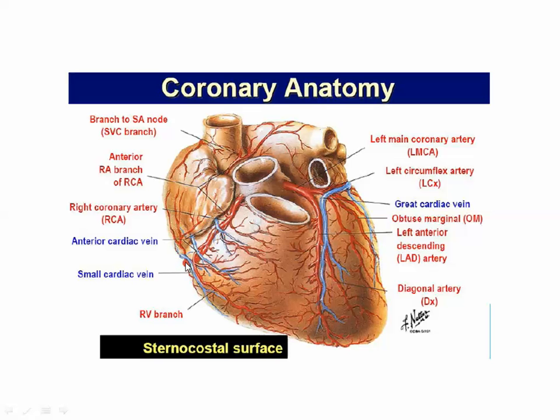So you have two planes: a horizontal plane, or oblique more or less, and a perpendicular plane on it. In the horizontal plane, the atrioventricular sulcus, anteriorly will be the RCA and then continue posteriorly, and here will be the LCX and then continue posteriorly. In the interventricular plane, anteriorly will descend the LAD.